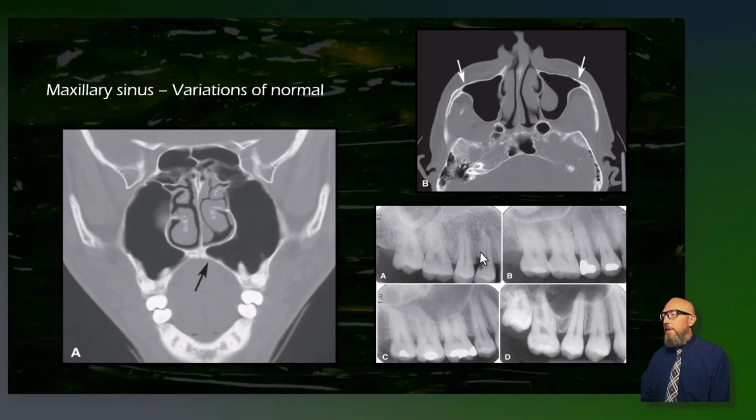And then these various periapical radiographs show variation in the size or the extent of the maxillary sinus. Note its position relative to the teeth. Here the sinus is maybe somewhat hypoplastic and way up here. This one's still small but larger than that, and it's encroaching the teeth. This one's probably more average, where it dips down a little bit between the roots of teeth, and then this one really dips down in between the roots of the teeth. And it continues to pneumatize over time, so you're going to see that with older patients. It can really dip down in between the teeth.